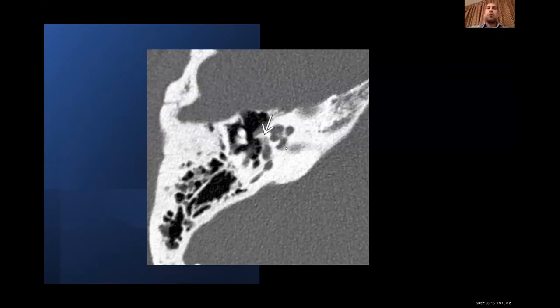The next, can you mention the pathology in the images? I made it easy because these images are from StatDX, so it is easy now. This is the pathology. This is the abnormality. Can you mention the pathology on the chat, please? What are the anatomical structures? What is the anatomical structure here? Great. So what is the pathology?